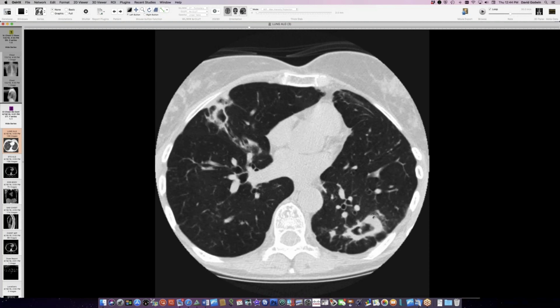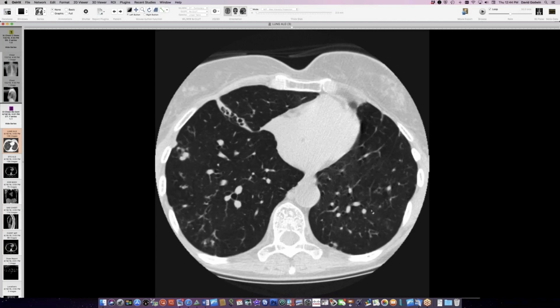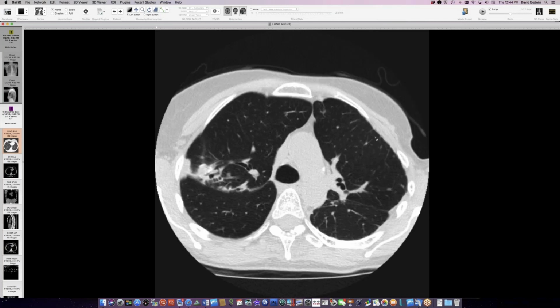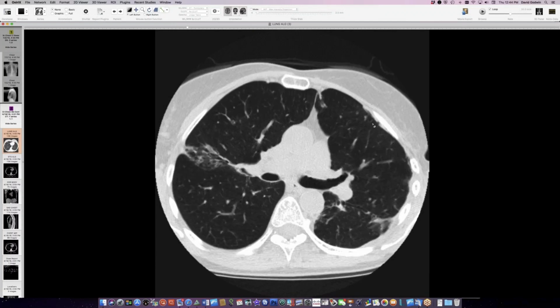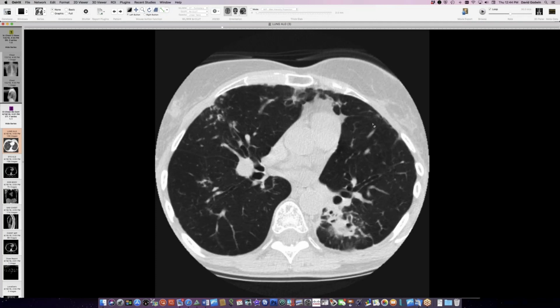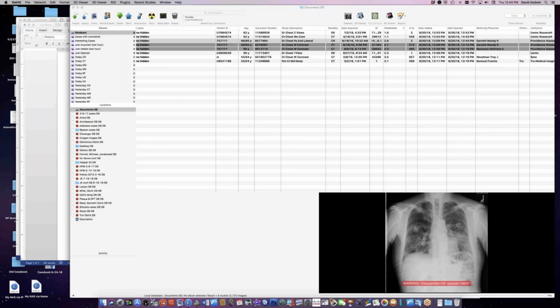And so this is a long smoldering course of atypical mycobacterial infection. There's no known immune deficiency at this point. She does have some radiation scar up here from the tangential conforming radiation that she got for her breast cancer, but I don't think there was, say, bronchiectasis in this location to be a setup for her acquiring the mycobacterial disease. So I'm positing that maybe she had some minor immune deficiency that set this up. And then once it's in place, it continues on its own, even if her immune deficiency was rectified.